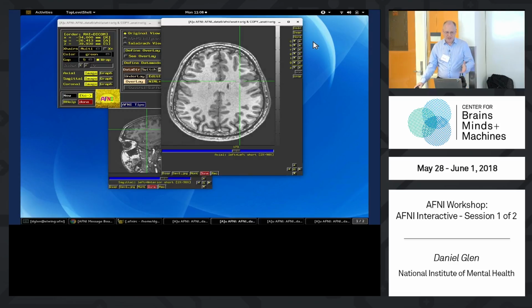We have a radiologist at NIH, John Buttman. He said, the way we do it in radiology is not like that. What we like to do is drag the mouse through the image. So it's the same thing as clicking the up and down on the buttons, but we're going to drag.